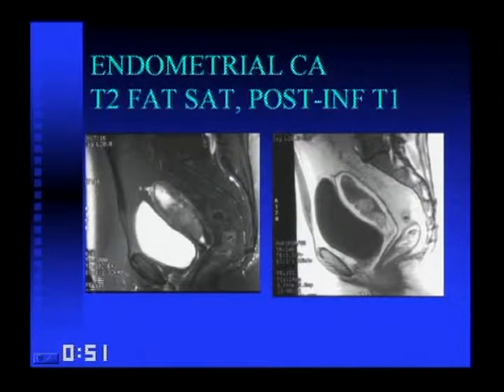Notice here, to orient you, this is a postmenopausal female, so the very thin myometrium is as expected. Here we have the junctional zone. Here we're starting the dark cervix, getting into the junctional zone. It doesn't show well here, but it did appear intact on the original images. As it comes down through here, you lose the junctional zone, and there was this lobulated mass in the cavity.